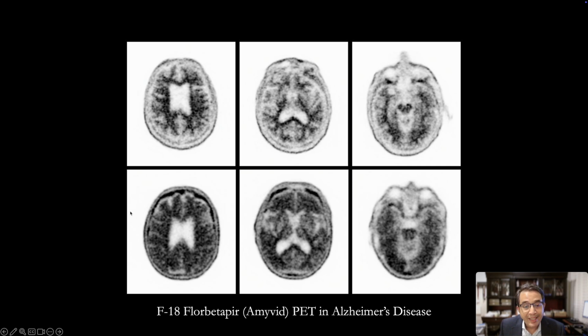And in the patient with extensive amyloid burden, look at what happens to the gray-white differentiation. It is lost because there is radiopharmaceutical deposition or uptake in the gray matter, and there is physiologic uptake in the white matter, so the gray-white differentiation is lost in patients who have amyloid deposition or amyloid plaque burden, and the images at the bottom are from a patient with Alzheimer's disease.